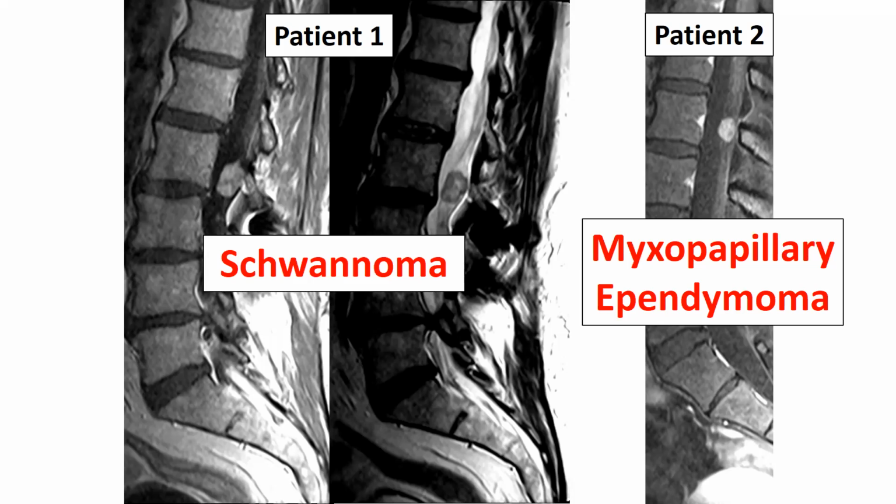Boxcar, like the railroad cars and the tractor trailers, are squared off, and that's highly characteristic of myxopapillary ependymoma. But as you can see in this example, schwannomas can have exactly that look. That's the point, and this is why there is always a differential, and you can rank the differential in what is most likely. And if you said myxopapillary ependymoma for patient 1, then you are dead on correct. That's what should have been number 1 in your differential diagnosis.